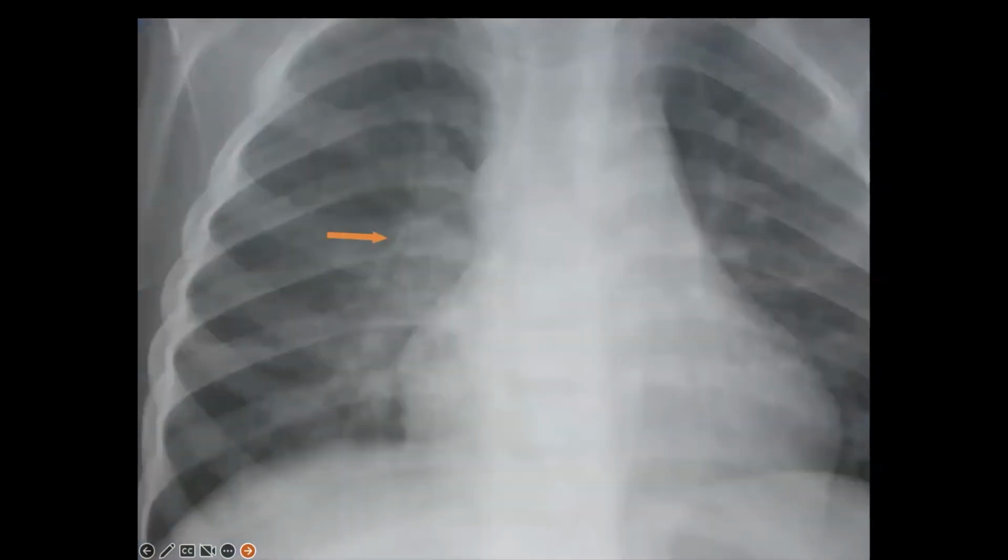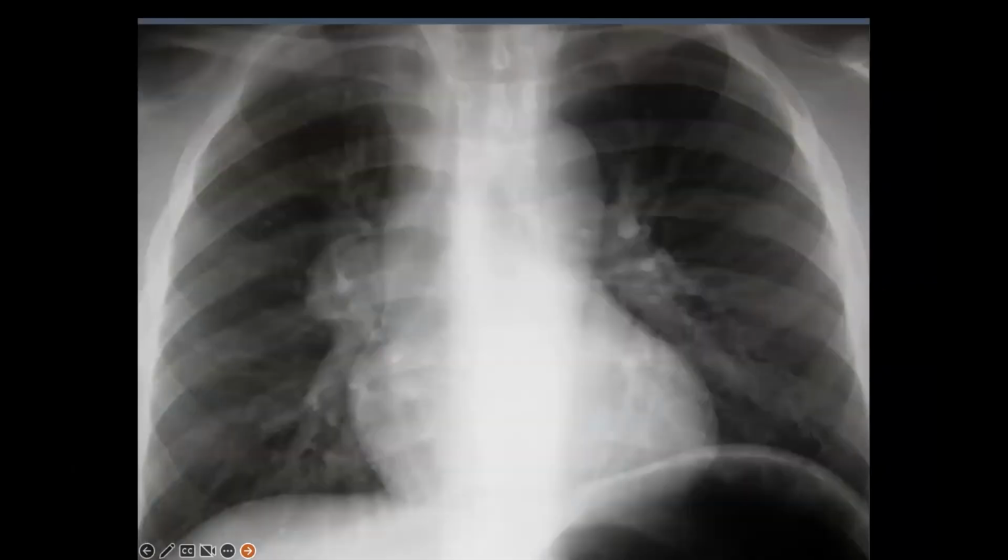When you look at this patient, you can see that hilum is pretty indistinct, and it makes it pretty difficult to see the vessels. So then you don't really know, do you have lymphadenopathy in there or not? And these are the kind of cases that can be very, very challenging, because you can have similar parahilar parabronchial opacities in a child that has a simple viral infection. And so you're not going to be necessarily thinking of TB just because you see this pattern.